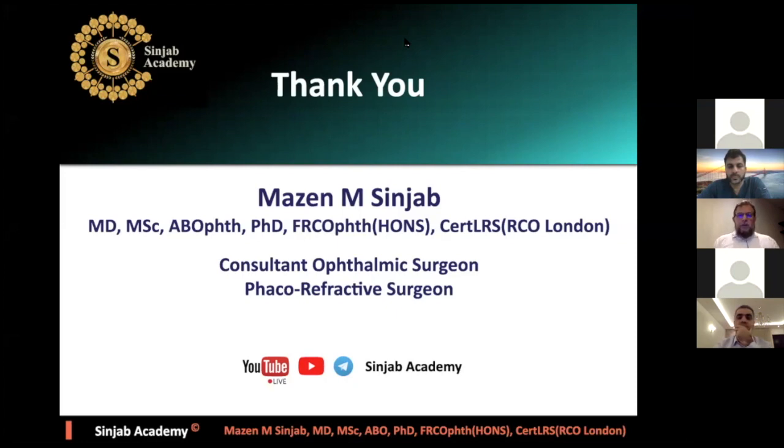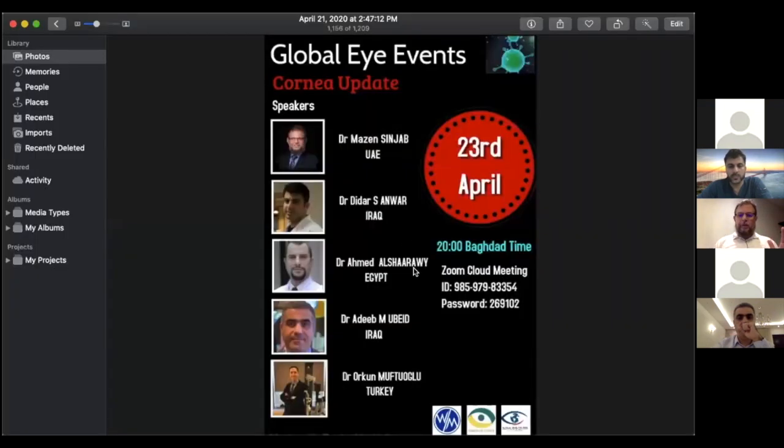Let me start with the second question. If you want to take the zone of 5 millimeters, then you are depending on the best fit toric ellipsoid, not the best fit sphere. The best fit toric ellipsoid is recommended by Jack Holladay, and it is mentioned in the Holladay report in the Pentacam.